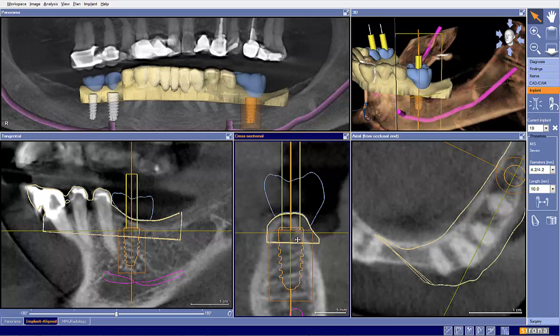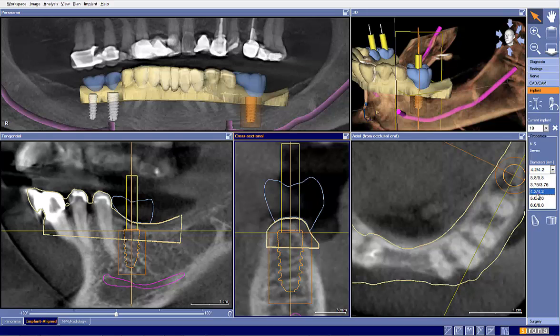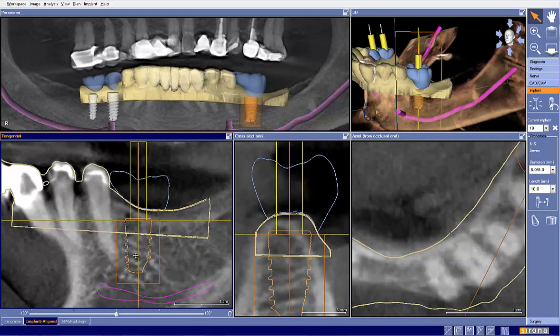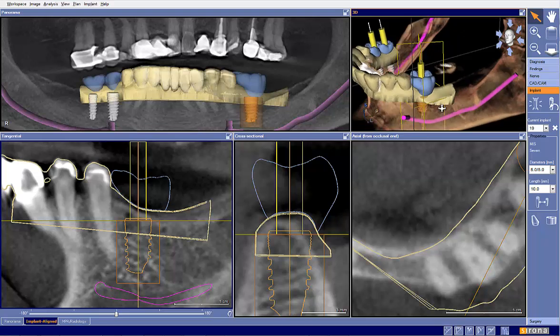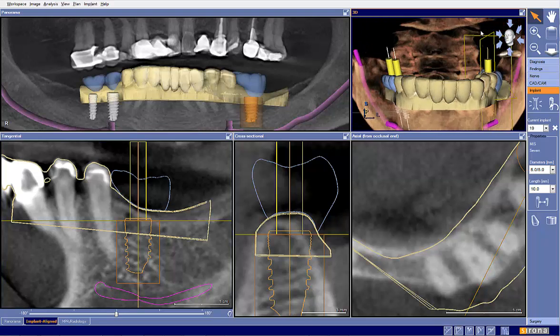So again, this implant I think can be placed up like this. Personally, I would go to the 5.0 implant, and I would just go ahead and graft this little bit of area here at the time of placement. We are close to this adjacent tooth here, so if anything, we could cheat a little bit more, and now we've gained some more of that space back, and we maintain that implant in the center.